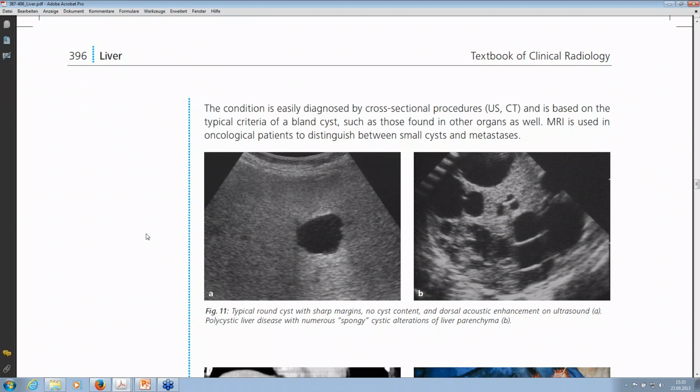No. There are some indicative signs. Colon metastases are very often hyperechogenic with a halo, there are cystic metastases from ovarian cancers, and there are multiple very small metastases from neuroendocrine tumors, but in the end it is unspecific. It is indicative, but we don't have a rule.